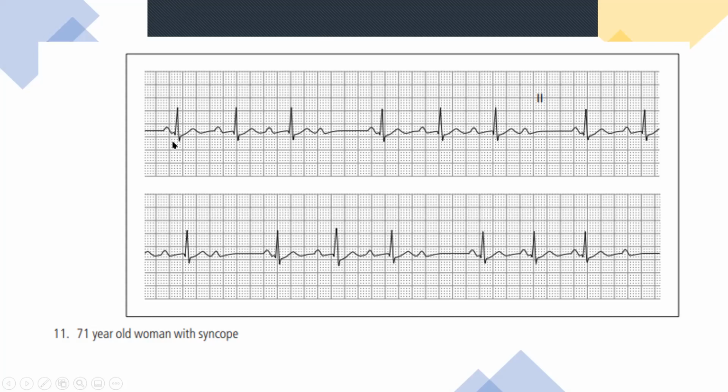First, let's start with our analysis, like how we normally have a look, where we look at our P waves. What you'll notice is that we have normal morphology of the P waves. The P waves themselves look fine. And then we come to the interesting bit, which is what I want you guys to have a look at, and it's the main focus of this lecture today. And that's the PR interval. So let's have a look.